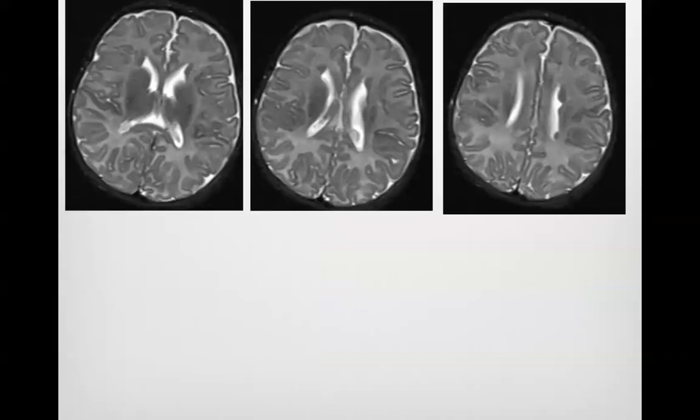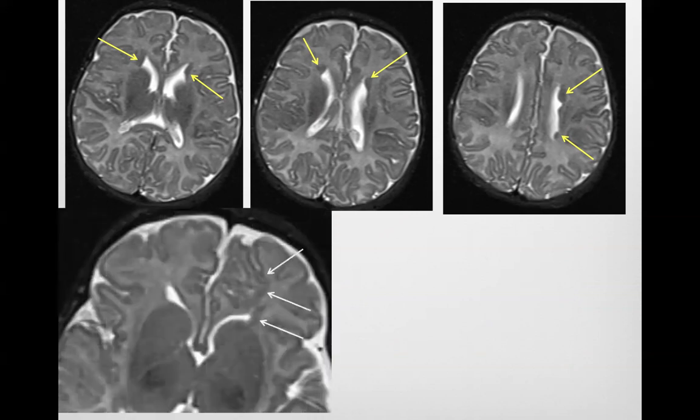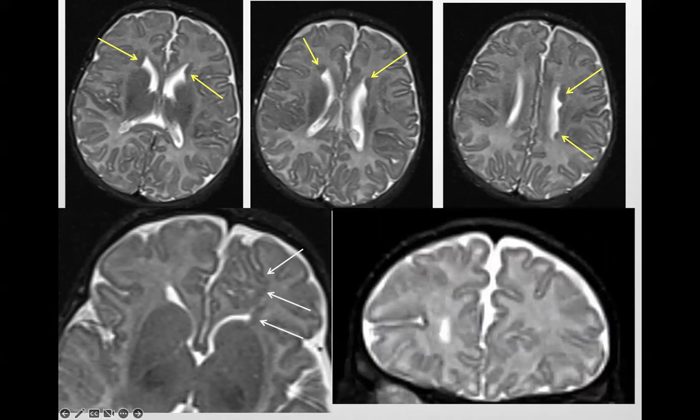And they asked for the brain as well, because there may be some brain abnormalities. And in this case, we see bilaterally a lot of nodules of gray matter heterotopia, but also an area of transmantle heterotopia and polymicrogyria on the left-hand side. Now, there is another lecture on gray matter heterotopia. It's another fascinating topic, but if you study gray matter heterotopia, you will know that some of them are genetic and there are some pattern recognitions that we can use, so different associations.